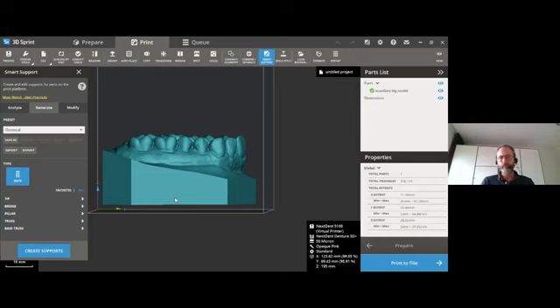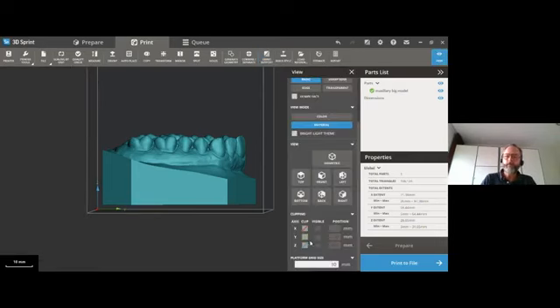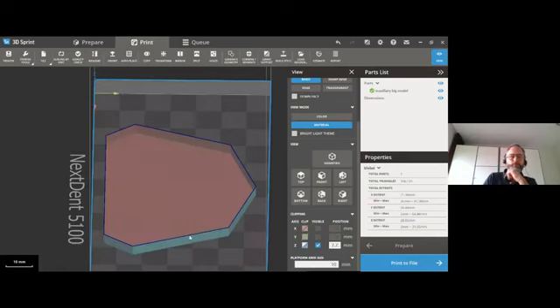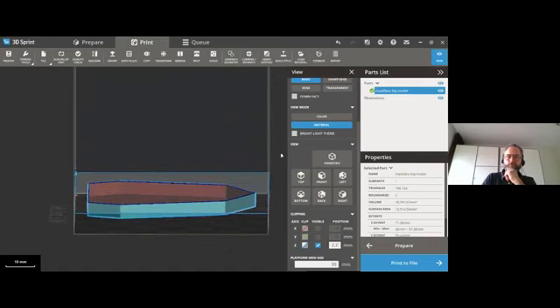Very good. Maybe it is also a good idea to check the printability manually yourself in the slice view or in the cut view. Manu, you want to elaborate a little bit on that, in the view function, the Z cut? Yeah, you're referring to this. Well, with this, you can first of all take a look if your supports are on the lowest points, that you don't have any free starting zones, and maybe also a little bit notice about the cups.